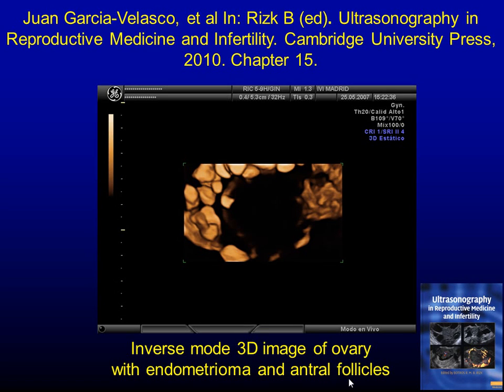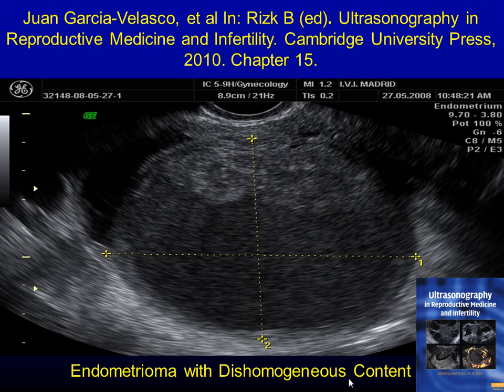They reach a point where you can just see them with ultrasound. Typically, that is between 4 and 6 or 4 and 8 millimeters in diameter. So this is an antral follicle, a woman who's been fortunate enough to have a high antral follicle count. So even if you remove her endometrioma, she will respond nicely. She will do well. Again, this is another endometrioma.